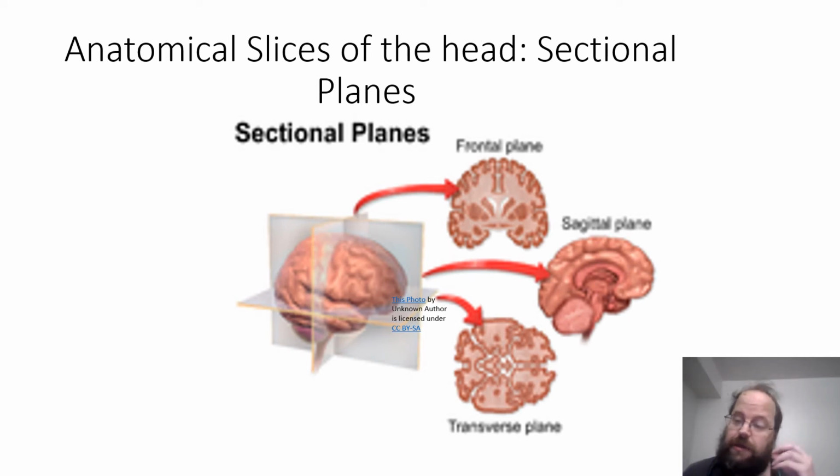All right. One thing that's important before we get into this is understanding that when you're looking at a brain, you're going to slice it in effect, and the computer does a certain form of slicing, so you could see the brain from different three-dimensional perspectives. Remember how I said the voxels, the pixels that are three-dimensional, allow you to look at the brain from different angles. And there are three main ways to look at the brain. You can look at it frontally, which when you're doing that, you'll be looking at the brain head on, and you slice it like a loaf of bread, and you can look at different depths as you traverse it back.